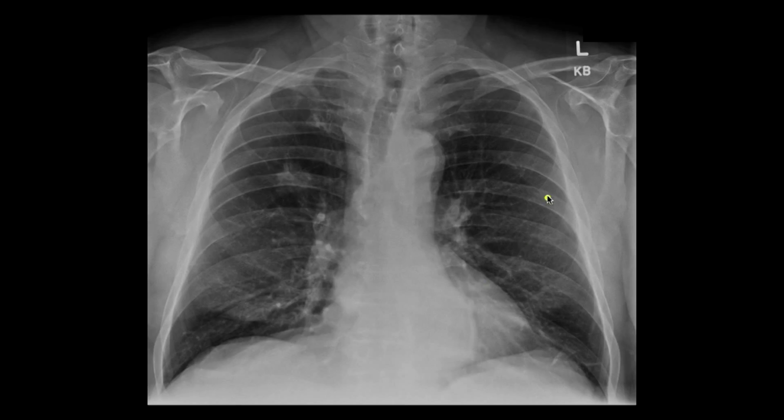Again, you've got to look carefully around the lung field to make sure that there are no additional findings in the lung. So we're looking around the left lung, and the lung field looks clear, maybe a little atelectasis at the base. Looking around the right lung, suddenly you can appreciate that this patient has a small irregular mass here, and this is just adjacent to the right hilum and turned out to be lung carcinoma. So make sure that you look carefully for any pulmonary masses.